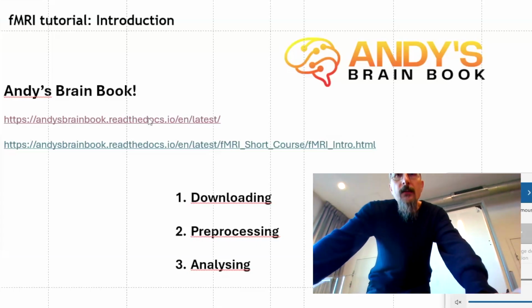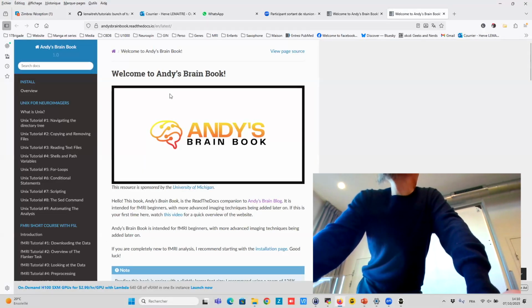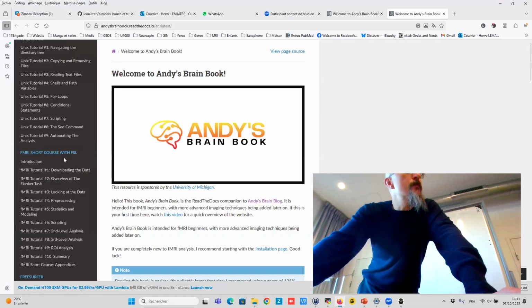So if I go there, okay, this is what we will use mainly. There is a part which is a short course with FSL, and we will mainly use all the instructions in it. Okay.